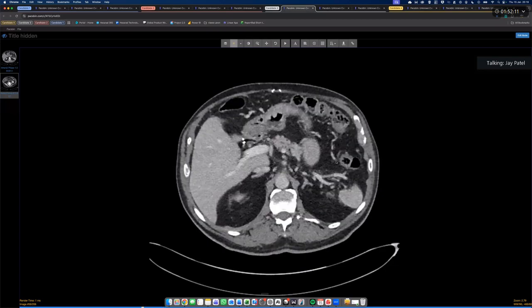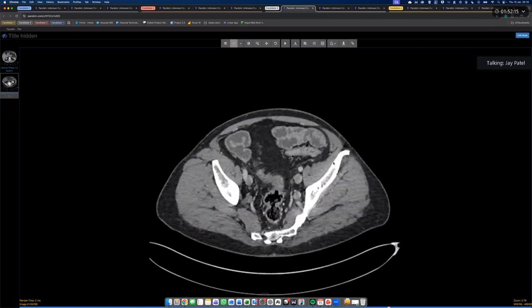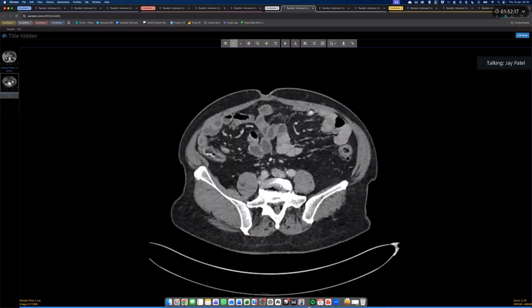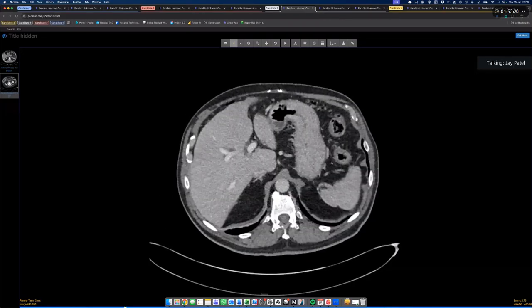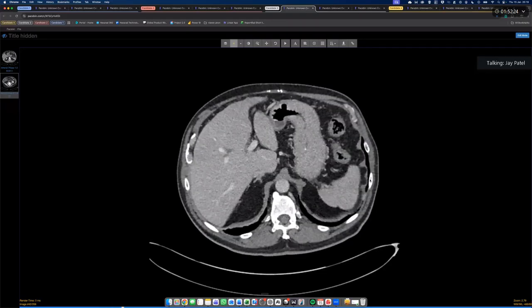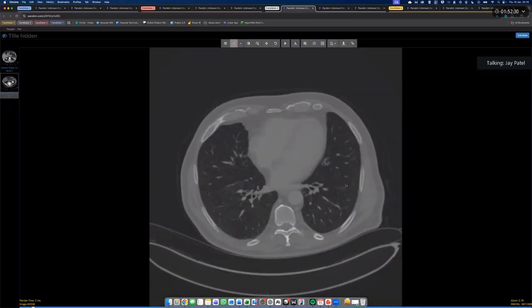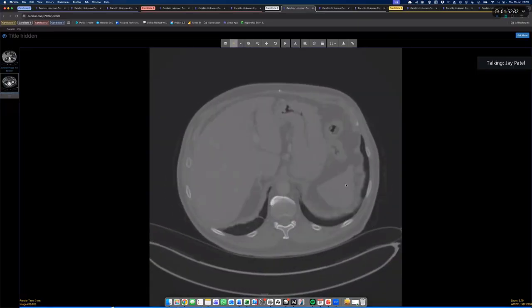I'm looking for peritoneal disease, given that pancreatic cancers can result in peritoneal deposits. I'm looking at other structures to make sure there's no disease. I'd like to look at the bones, they'd say no. I'd like to look at the lung bases for pulmonary nodules, they'd say no. And I'd recommend referral to the MDT, completion of staging, and consideration of a CA 19-9.